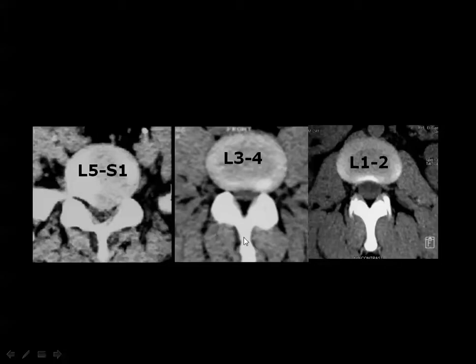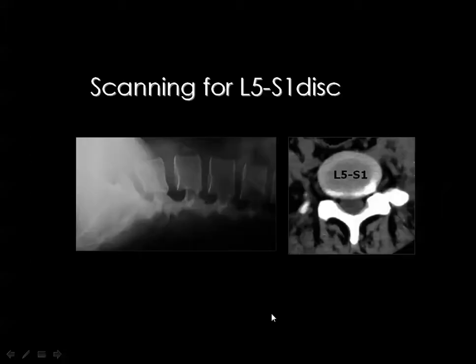normal disc. And if you look here, this disc has a subtle concavity in the posterior border and is considered within normal as well. This appearance is usually seen in adolescents, and this is usually seen in adults. But this disc with convex posterior margin is considered abnormal. This is disc bulge or herniation, as we will discuss after that.